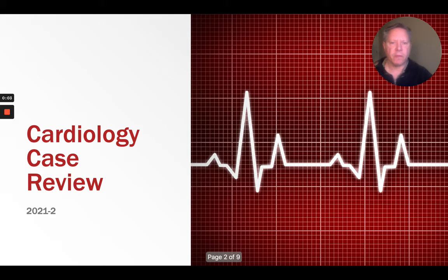All right, so far we've looked at bundle branch blocks in general, how to detect them. We've looked at left bundle branch block and right bundle branch block and what they look like and how to detect them. We've looked at left bundle branch block and what's normal and what might be pathologic. In other words, what might be a STEMI on an electrocardiogram with a left bundle. So lastly, let's look at right bundle branch blocks.